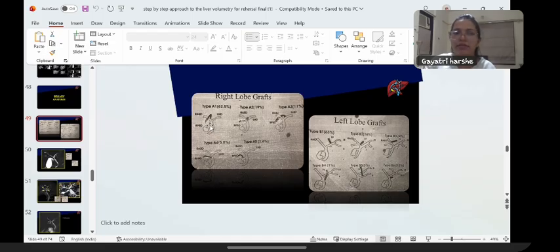So it is very important, not just the type of anatomy. If I say this is type A1 anatomy and the patient has to undergo two ductal anastomoses, then it is important to describe that there is a short right hepatic duct. That is more important, the length of the hepatic duct. Diameter as such will be variable, ranging from 2.5 to 4.5 millimeter, so that doesn't matter. It is the length of the right hepatic duct.